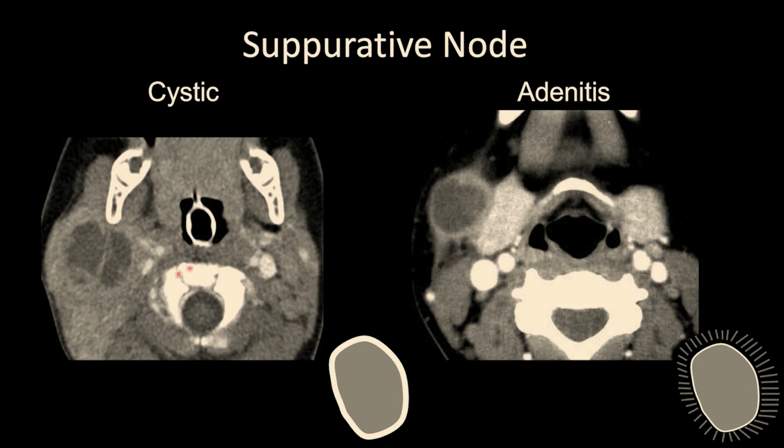How does that differentiate from here? Well, now you're seeing some inflammatory change around this lymph node as well, which you're not necessarily seeing with this. The fact that you can't separate this lymph node from the surrounding musculature is very different than inflammatory change in the fat. There are two distinctions you want to make here. This looks infectious to me. And this could be cancer also, but this looks more infectious to me. This looks like a necrotic metastatic lymph node that has invaded itself into the surrounding soft tissue, what we call extracapsular spread. I'm going to get into that in a second.